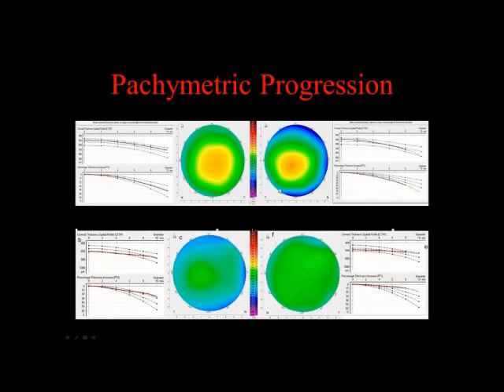This is an eye highly suggestive of keratoconus, even though if we look at just the apical reading with an ultrasound, they would read identical. Both these corneas are 150 pounds. One of them is 5'2", the other one is 6'4". It doesn't mean they're both normal. So that's a big advantage of looking at pachymetric progression.